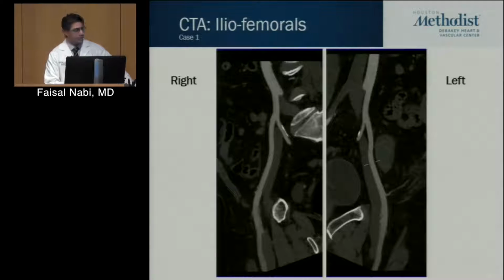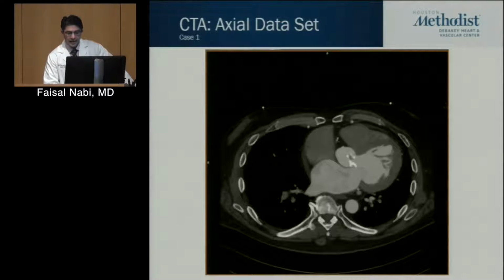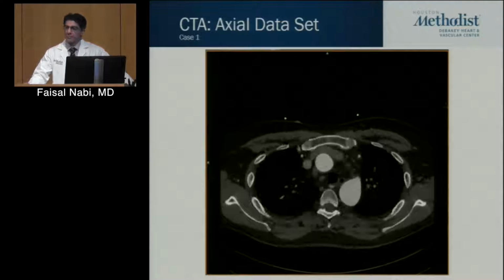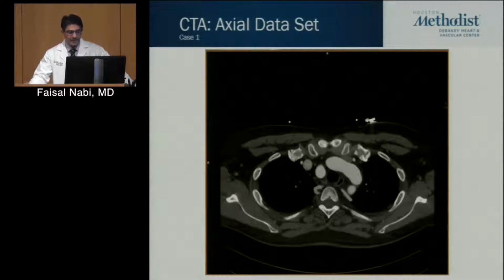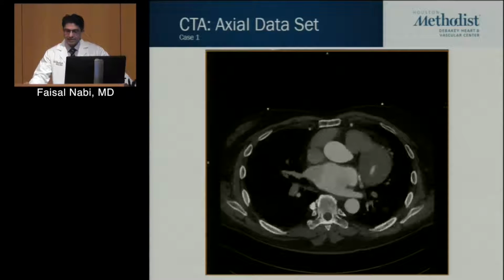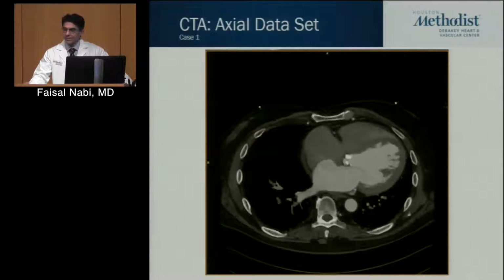Taking things further, obviously part of the TAVR planning is to know the iliofemorals. We were able to do that as well. Now, take a look at this axial data set. Obviously, it's important to review all the data. I'm not going to give you the answer, but I'll let it play one more time, and then we'll get a show of hands.